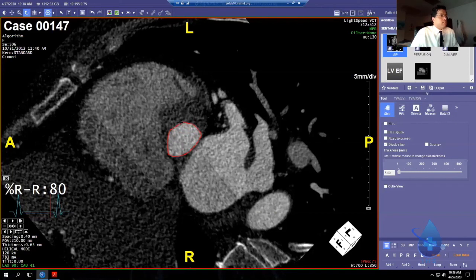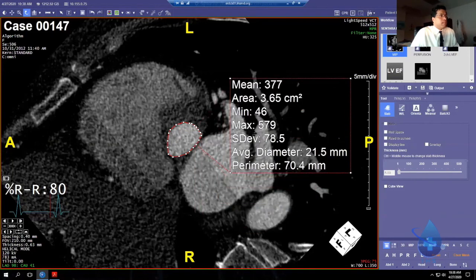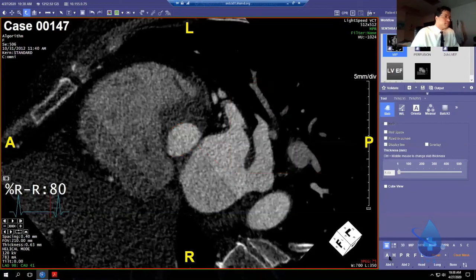And this is 90% of what they want from a TAVR scan, okay, is what's the valve area so they can put that in a valve sizing chart and its perimeter.